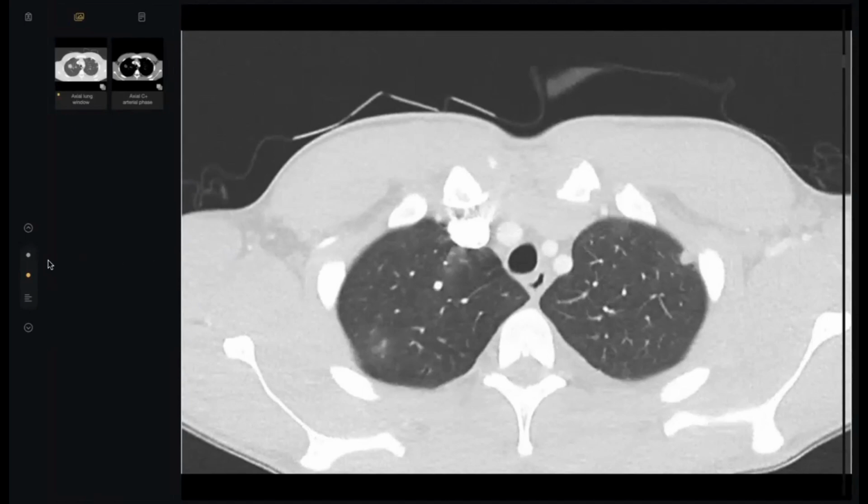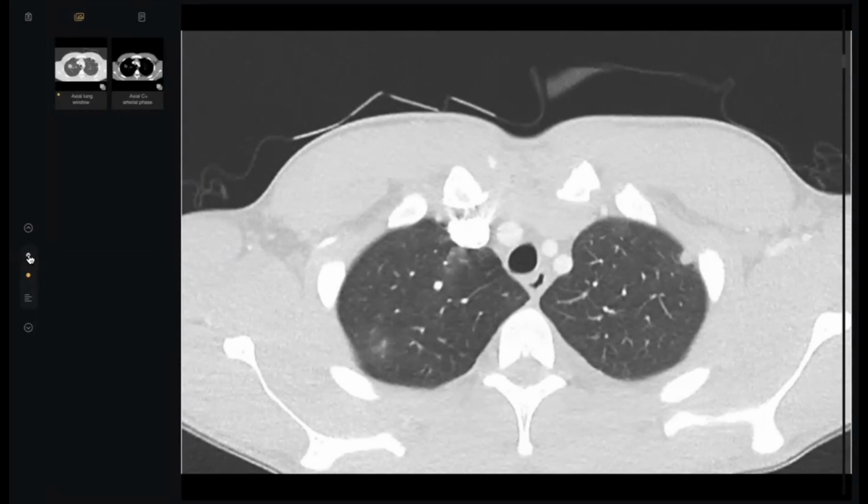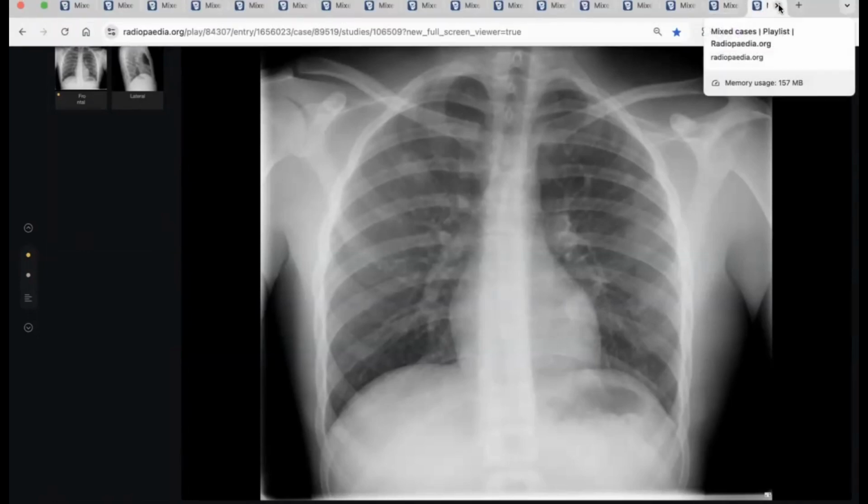The first line of treatment here: number one, to rule out the cause, whether he is a drug abuser or not. Number two, to give antibiotics. Look here, my colleagues. The right upper lung shows a cavitary nodule here, and there is another one here. At least you can detect two. And I give you a history of fever, so you can ask for a CT scan. Thank you, doctor, so much. Septic pulmonary emboli. Next candidate.